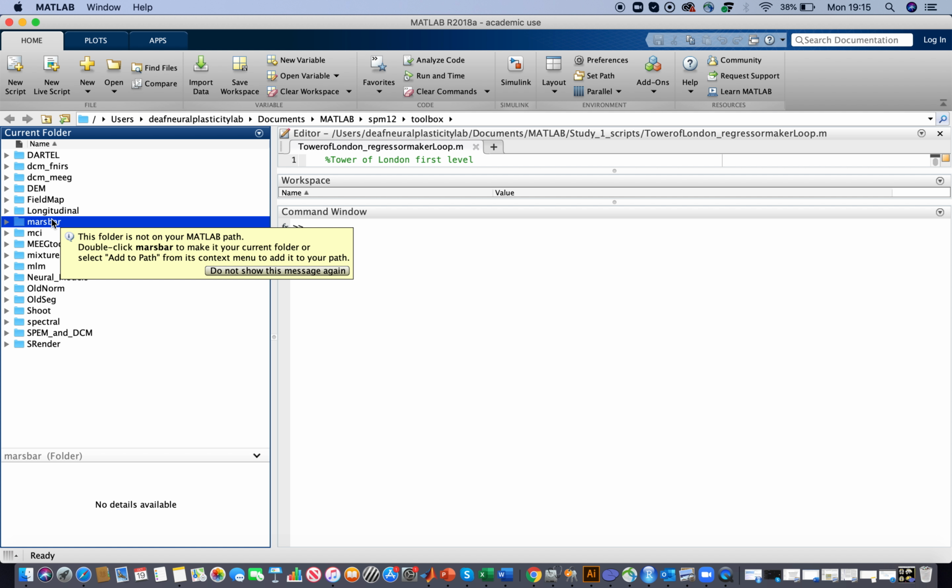But another important operation we are going to do is to separate these regions, because in the map that we created from ImCalc, we have just a binarized mask where some voxels are attributed to 1 and some voxels are attributed to 0, but they are all together. So we are not able at the moment to look at the dorsolateral prefrontal cortex, or the superior parietal lobule, or other areas. So what we want to do is to transform them in marsbar.